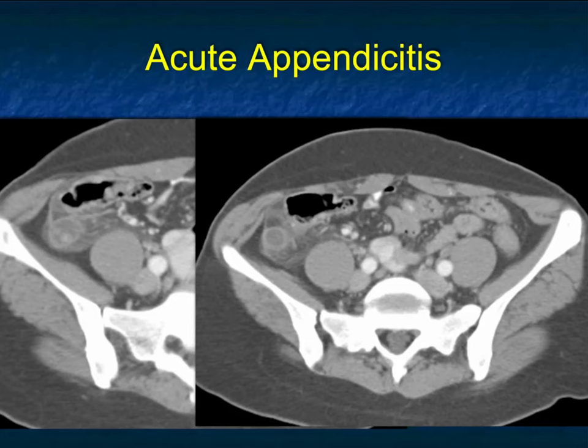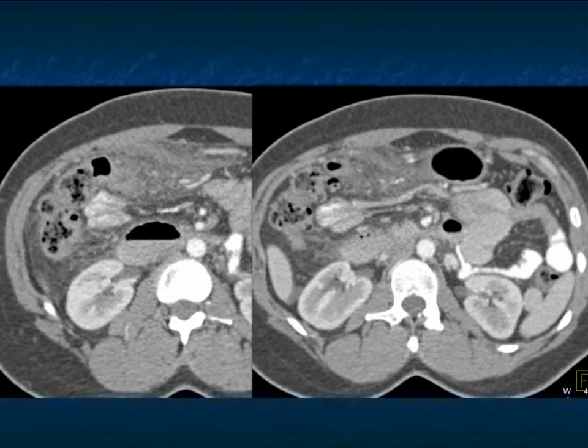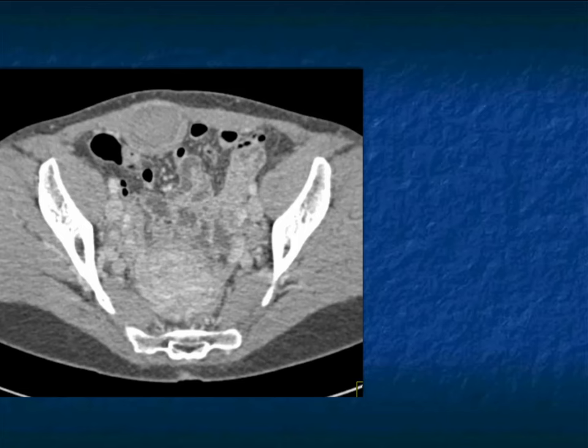So here's a patient with surely acute appendicitis, a markedly dilated appendix, and lots of inflammation nearby. But as you scan a bit upward, you see inflammation tracking by the ascending colon and near the transverse colon. This is appendicitis with abscess, local inflammation, and the patient seems to be on the way to developing peritonitis.